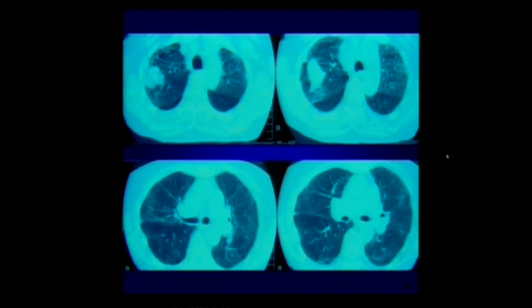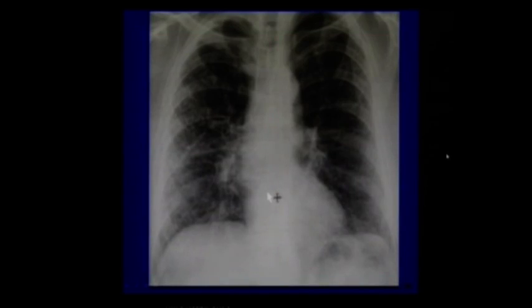See, this is a case of a mass lesion. In a case of quite rather early IPF, you can only see subtle features of usual interstitial pneumonia. And also, when malignancy superimposes in a case of idiopathic pulmonary fibrosis, it is very difficult to differentiate in the chest X-ray. Normally, you report even small lesions in chest X-rays and subject it to CT.